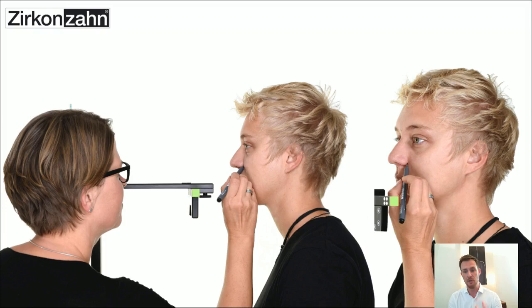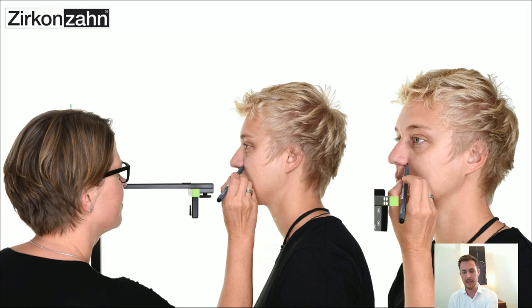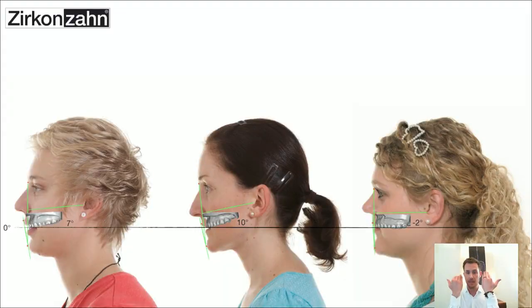I'm able to do that very easily in a digital way. I mark the patient's face, and then I have special measurement tools in our software to detect the angulation and transfer it into that specific individual virtual occlusion plane. As you can see, the plane is not straight and it is separated in the middle. The reason is that we measure this angulation on both facial sides, left and right.